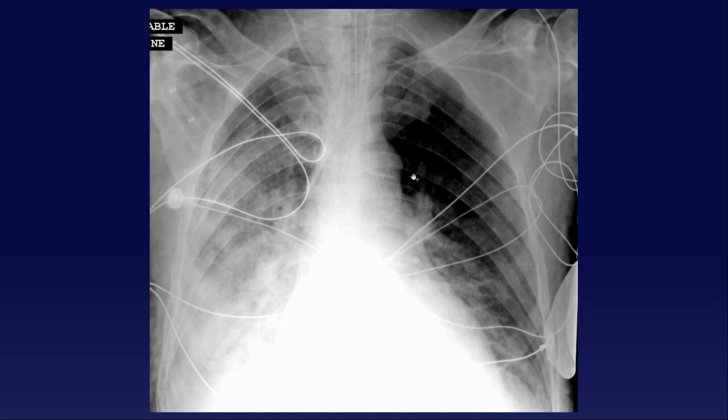So typically for these, you'd call vascular surgery and tell them there's an arterial line, and they need to basically close the arteriotomy site when they remove it. So you don't just want to pull an arterial line. That's actually really important, okay? Right.